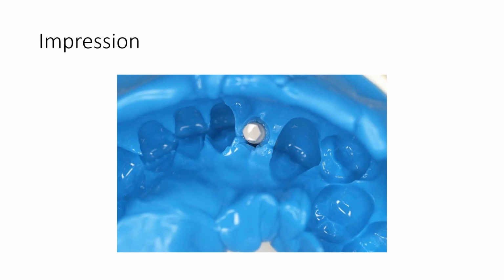When the impression is removed, you can see that the Ankorlock quick transfer has been trapped within the impression material. Now we can tell that this has been taken off a transfer base or at soft tissue level, because you will notice that there is a recording of the top of the transfer base. So this helps technicians to just confirm how the impression was taken before going on to produce the definitive analog model.